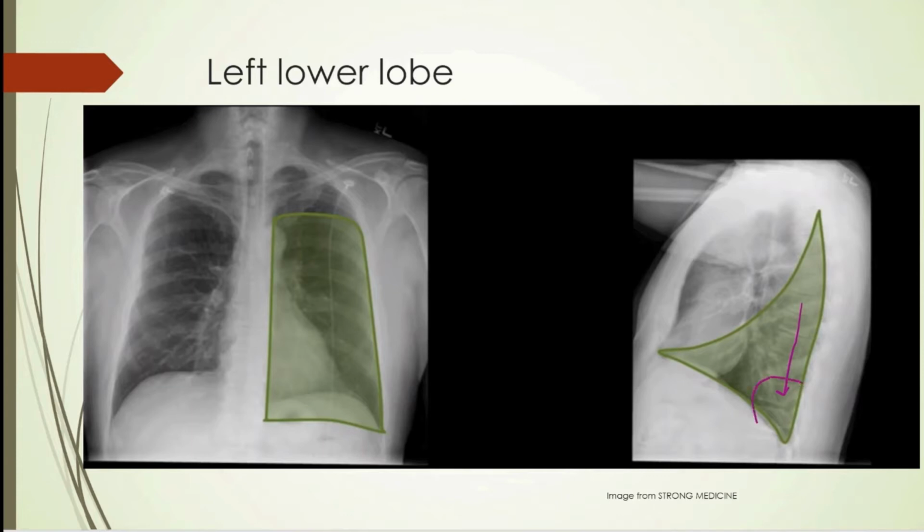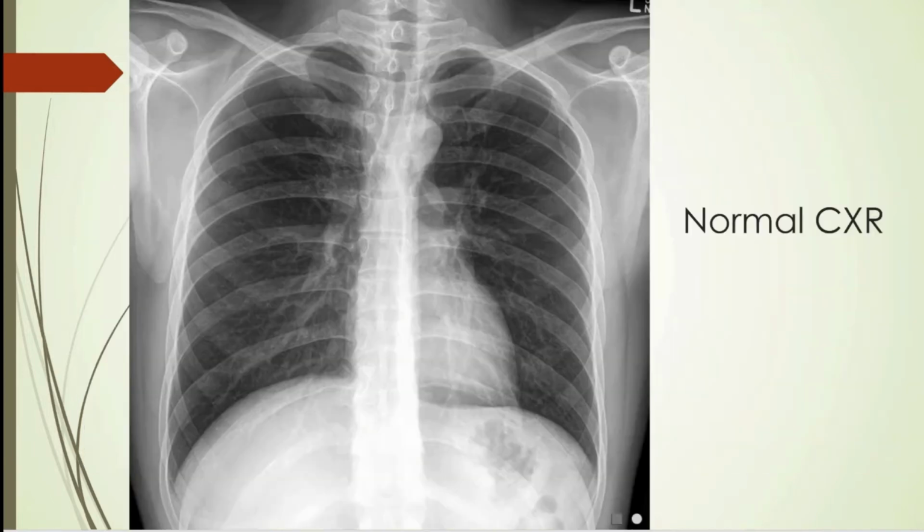So again, down here, these might be white or whiter than up above, and that's something to pick up. Again, if you have an infiltrate and it obscures, say, part of the heart, that's a way of telling that there's an infiltrate going on there. And this just takes practice reading chest X-rays, looking at every one, and before long you can pick them out.